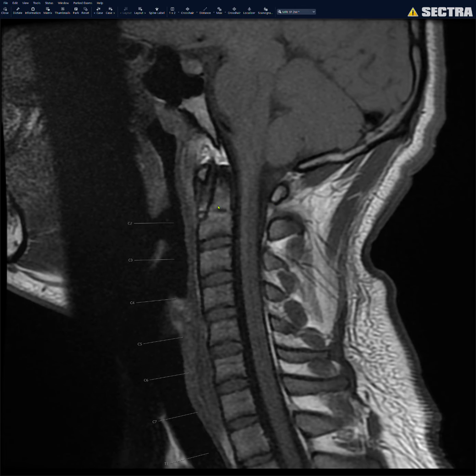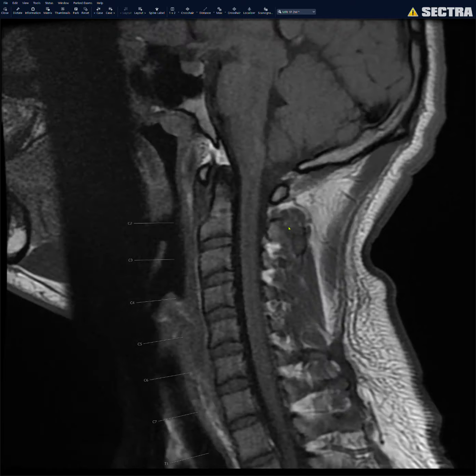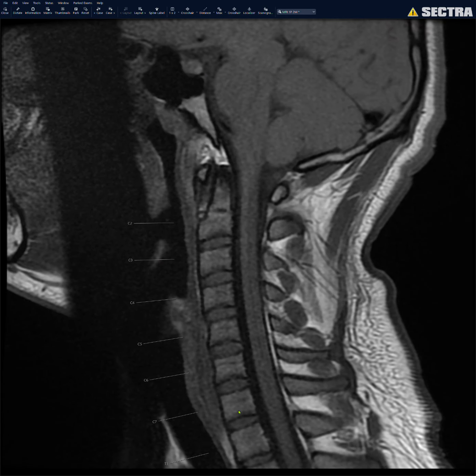Okay, and then I look at the vertebral body bone marrow signal. So on the T1 images, the T1 bone marrow should be brighter than that of normal disc. See that? T1 bone marrow is brighter than disc. And also another reference is that it should be brighter than the surrounding skeletal muscle. See, the skeletal muscle is dark. The bone marrow is nice and bright on T1, so that looks normal. And then sometimes I can see alignment a little better here on the T1 images. Okay.